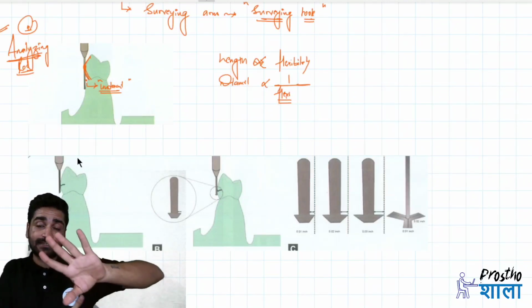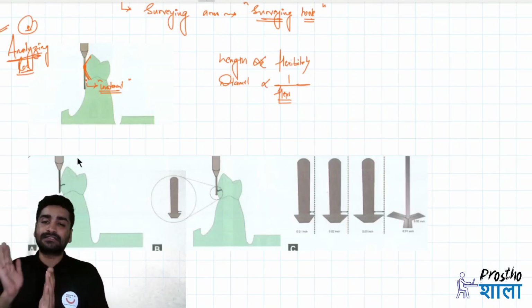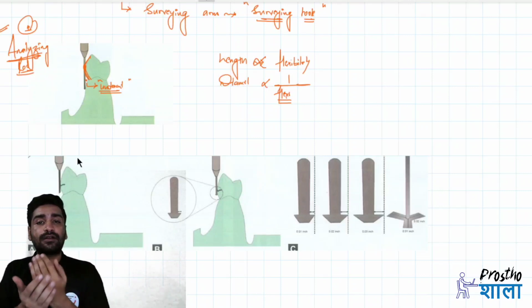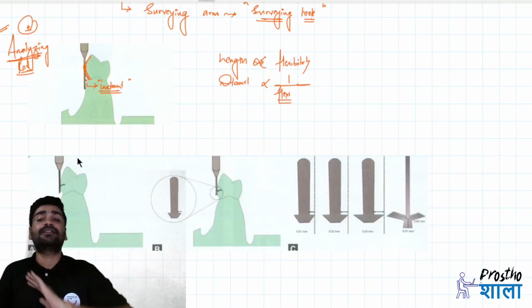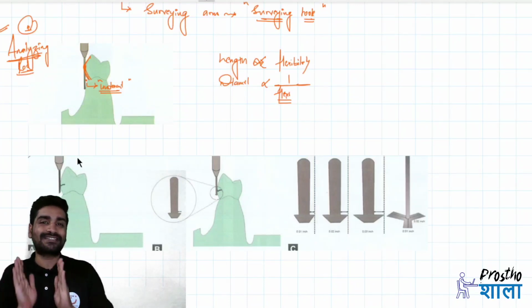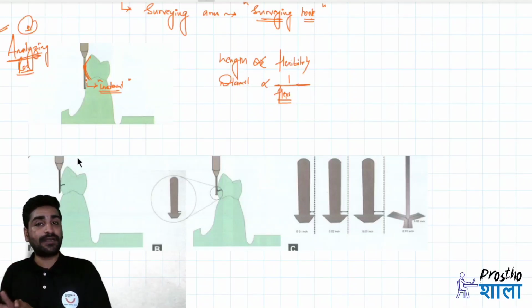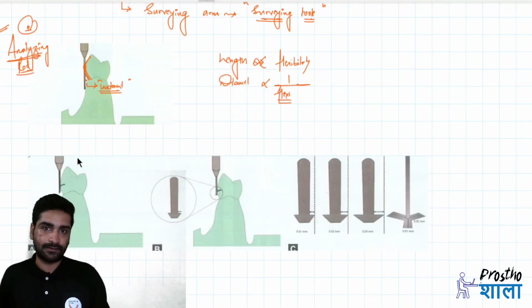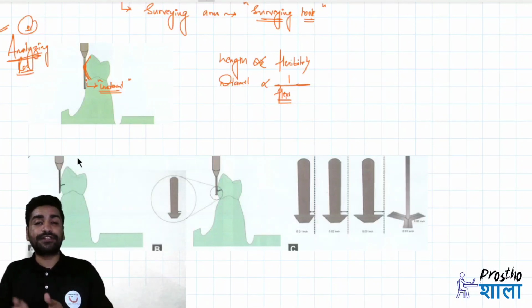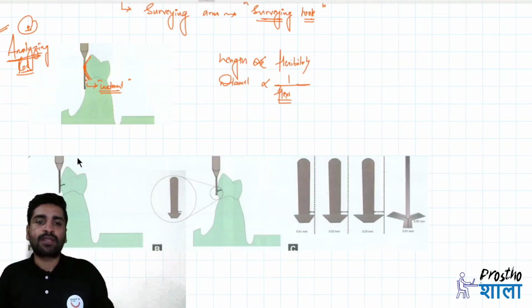And it's not such that you only check the abutment teeth; you have to check all the teeth, because sometimes some teeth might be more tilted or wrongly placed in the arch, which might affect the design of your denture, right? So you should not stick to just delineating or analyzing the contours of abutment teeth, but also visualize other teeth and the structures around them, so that they don't influence or affect your design of removable partial denture. Correct? So this is about analyzing rod.